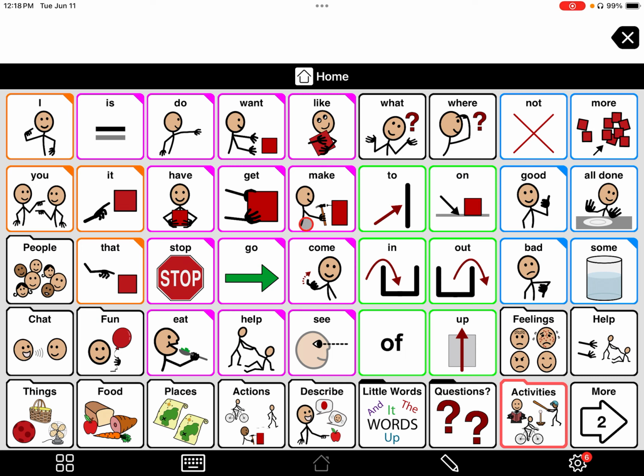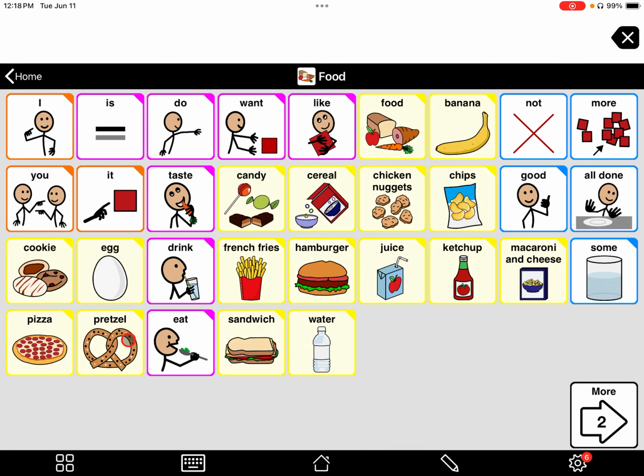To change the grammar of a message, you simply have to hold down your tap on a button. So if you want to say that you ate a food in the past, I hold down this button. Ate. Hamburgers, I ate hamburgers. So then you can change the verb and you can also change the part of speech of any other word as well.